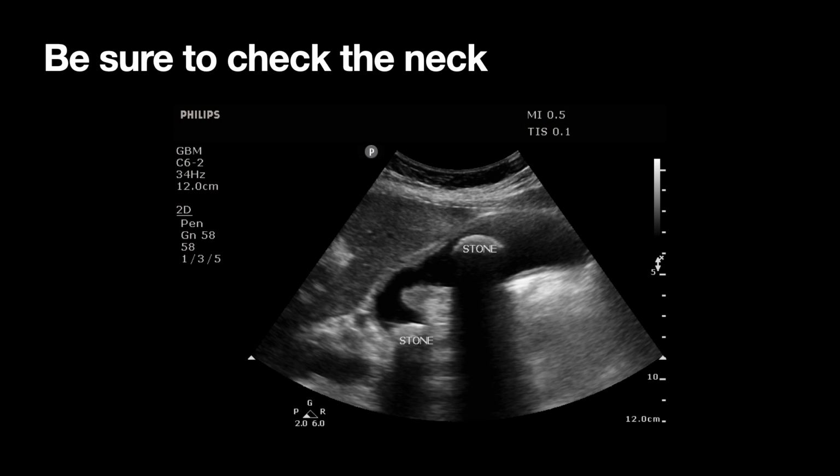So with that said, there's a couple mimics that we need to be aware of, right? A couple things that we want to think about as we're looking through these patients with biliary disease. The mimics are polyps, sludge, clot, and non-shadowing stones, right? So let's process through these.